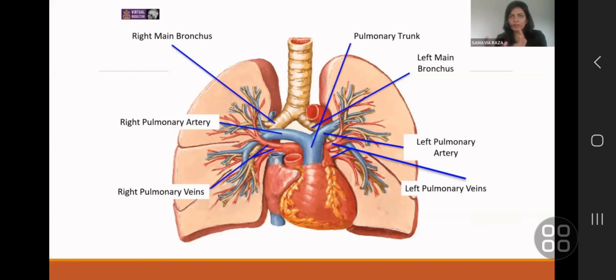The anatomical reason for the difference in height, or the slightly different appearance on CT, is that the right main bronchus is on top of the pulmonary artery, whereas on the left it's behind it. It's something that is very important to a surgeon or somebody doing endobronchial procedures. It's not that important to a radiologist because you're not looking at the location of that structure.